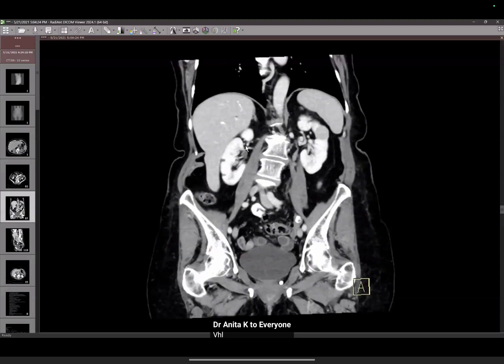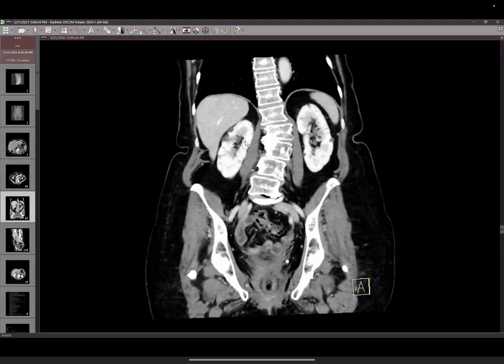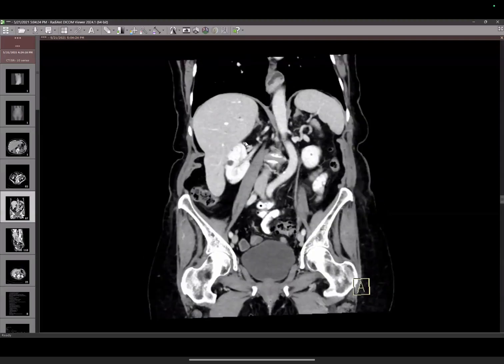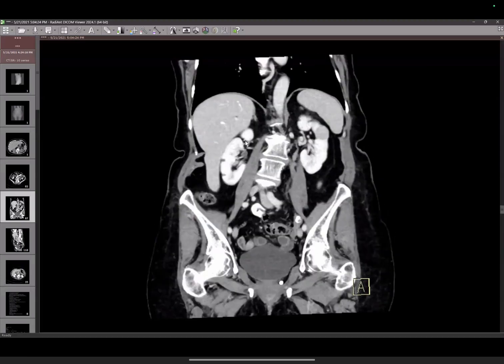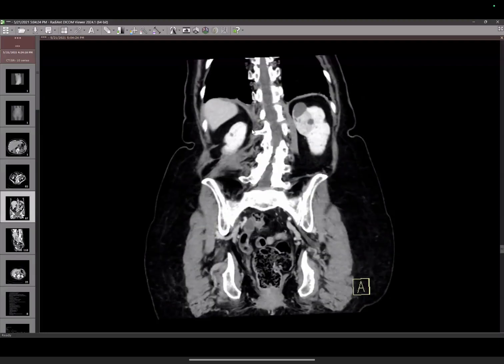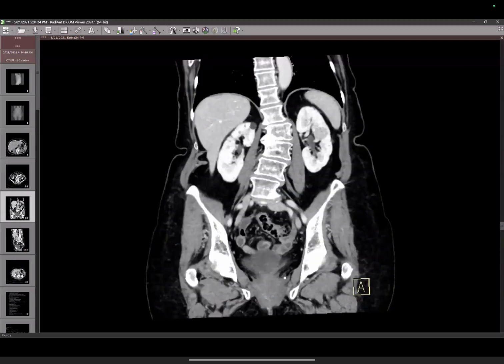Which are some of the syndromes you'll think of? VHL. Tuberous sclerosis. Tuberous sclerosis is more likely to cause angiomyolipomas, right? But they are RCCs, you're right. So VHL would be one. And then a couple of other entities can give rise to this pattern. And we, as radiologists, are the first ones to call attention to that, which is what happened in this case. Birt-Hogg-Dubé syndrome.